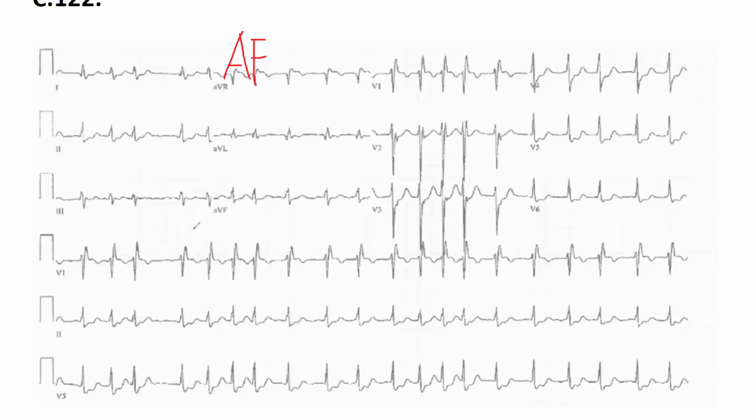Next, QRS. Maybe wide. Look at V1, V6, or lead number 1. It is wide, yes.